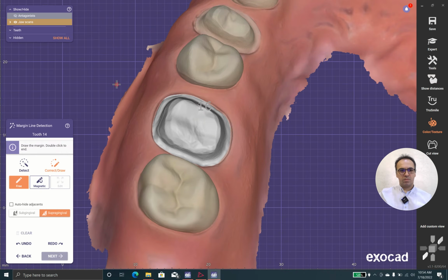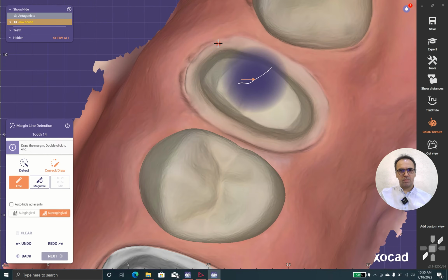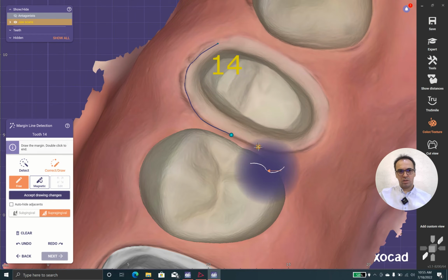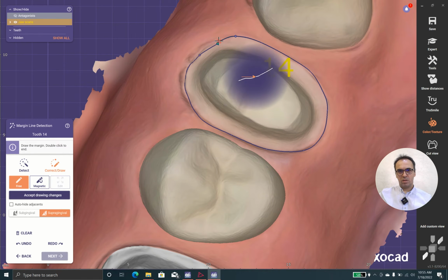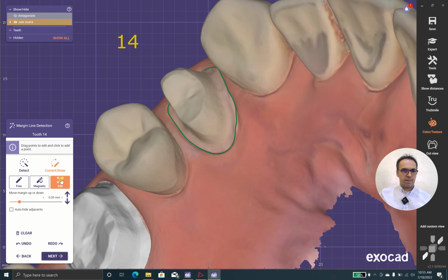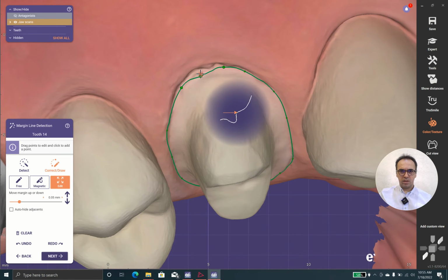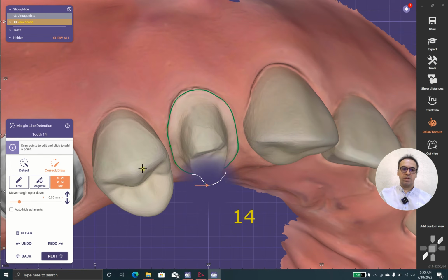And now the 2.14. Till now I didn't see any big difference with the 3.0. We have this, but we have this in expert.